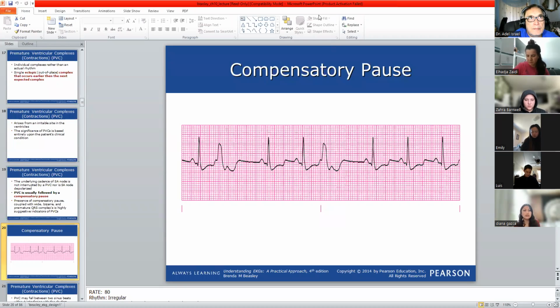They're abnormal. You see the P wave is abnormal? It looks like there's two of them. Two of them? You see this one? That one has one. And this one? That one has one. And then this one. Let us go step by step.